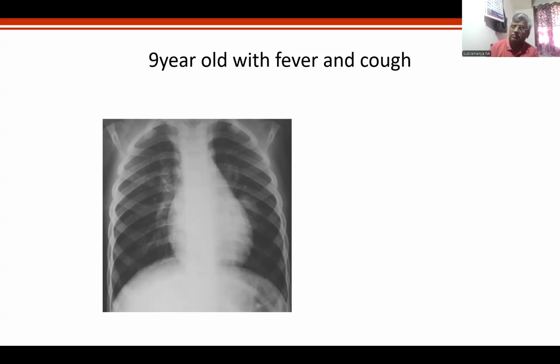Now, what was your problem? Somebody started with an inspiration film. So, suddenly don't jump. I distracted you. Don't jump. See, everybody should start.